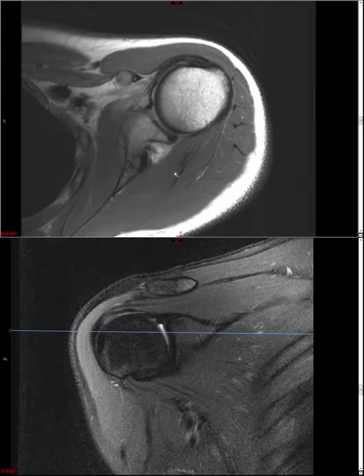In truth you can actually have biceps subluxation without a subscapularis tendon tear, but for now let's just assume that if we have a subluxed biceps, there is an underlying subscapularis tendon tear, and so if you see one you should look for the other. Generally that's why I tend to read both together, because I find that most of the time I end up reading both together anyway, trying to figure out what's going on. Okay, so that's my blurb on rotator cuff and biceps. That's a huge chunk of the interpretation right there.